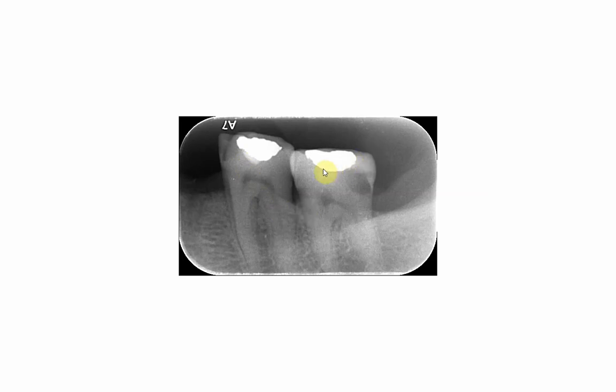Mind you, sometimes the liner material, whether it is zinc phosphate cement or sometimes zinc oxide eugenol, was left as a liner, with lesser radio opacity compared to the cement. Sometimes you will even find, as we will see in other radiographs, a subliner, which is mostly Dycal, used especially in deep cavities. So you will see the subliner, the liner, and the amalgam filling.